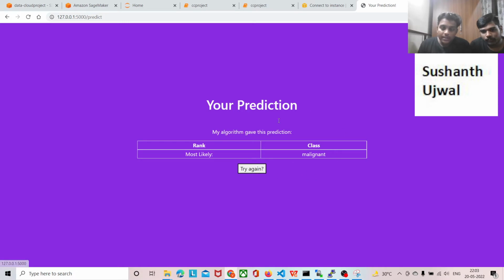So this is how our application runs, which is useful for many people who are unable to tell what kind of skin disease they have and feel shy to tell the doctor. This can help many people recognize what kind of disease they have before going to the doctor's observation. After knowing this, they can also start using medication so that they can cure the disease before going to the doctor, or they can control the disease.